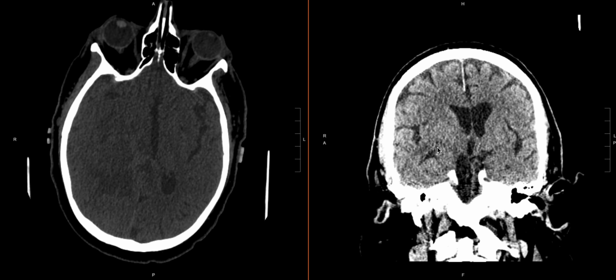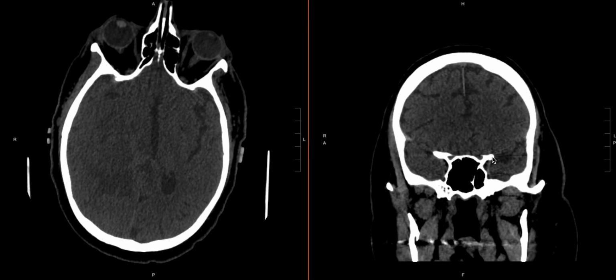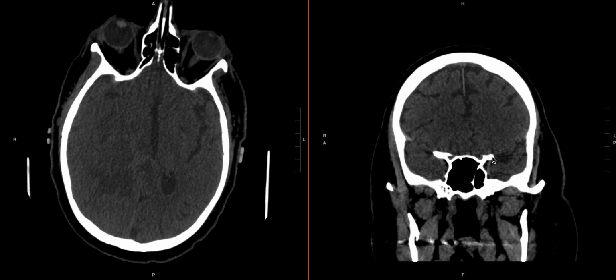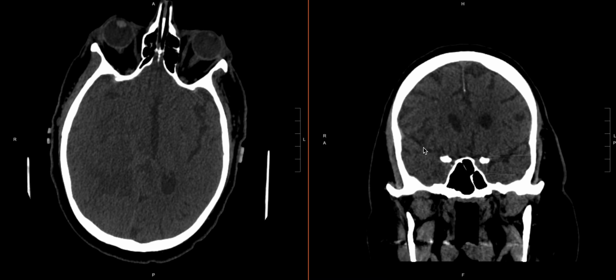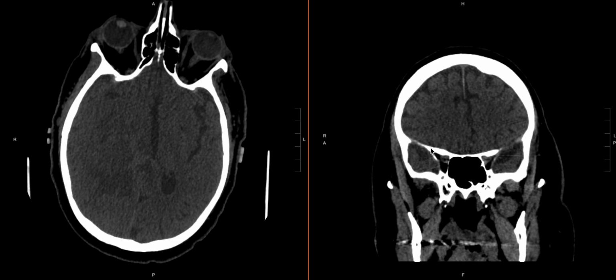Now, we talked about previously how it's useful to have the coronals, and we can adjust and get to our subdural epidural window as well. But really in this case, the coronals are not going to be the most helpful. Technically, you can see that there is the subdural blood right here along that area, but it's very subtle, and it's going to be very hard to definitively say that there's more on one side versus the other.